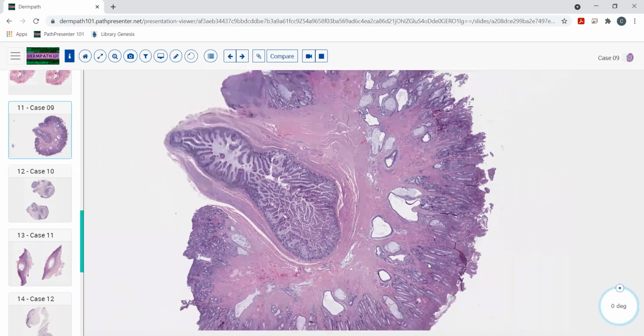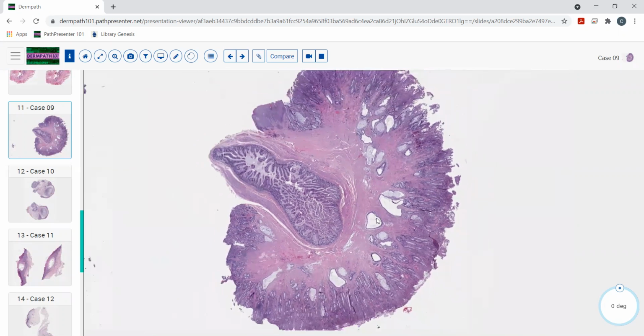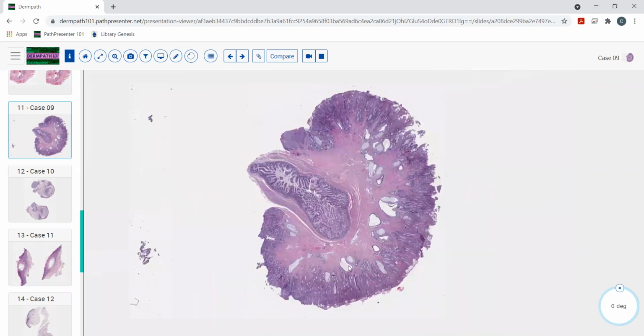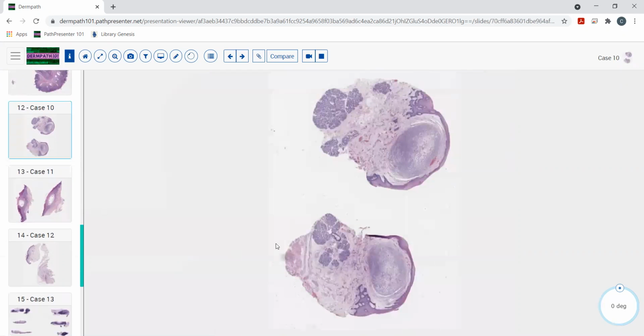But if you see something like this, you've got a cystic area over here that's really lined by epithelium. Then you've got this little papule, and it occurs in a kid, maybe clinically looking kind of like a pyogenic granuloma. Think about this omphalomesenteric duct cyst. Okay, so that's relatively rare, but at least hopefully you learn something from it.